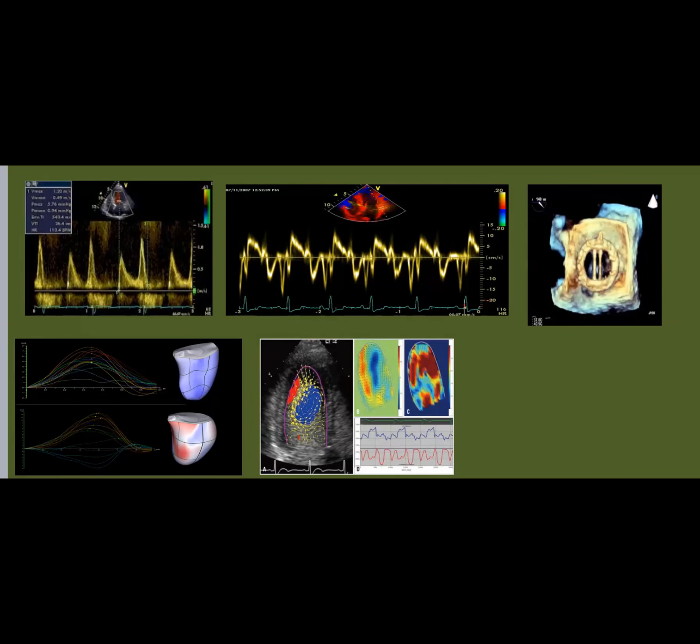So now I'm not going to talk about mitral stenosis in area and gradient, but we'll be talking about mitral stenosis in flow map, how the map of severe mitral stenosis shows in the LV.